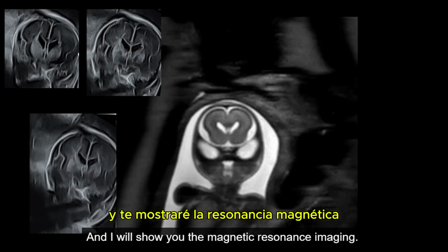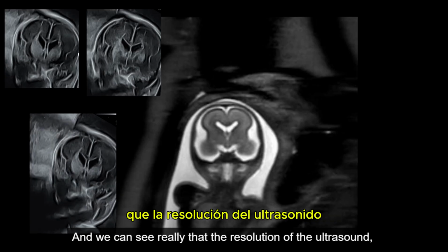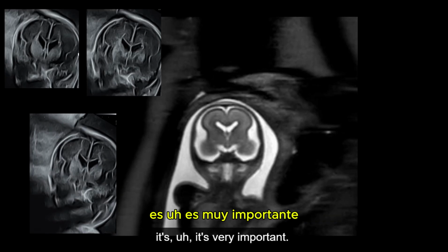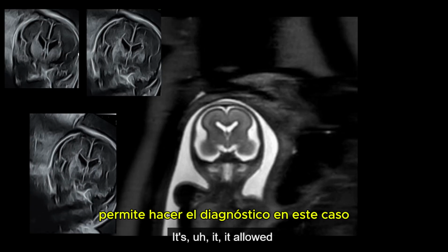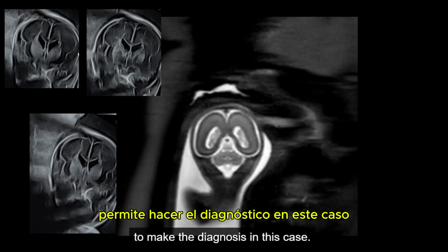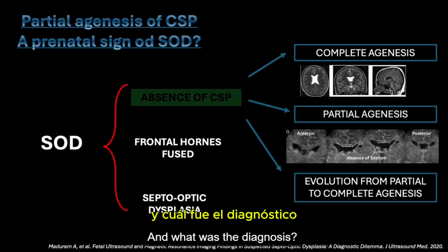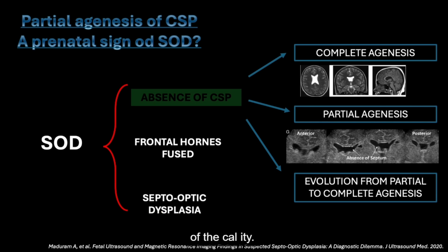And I will show you the magnetic resonance imaging, and we can see really that the resolution of the ultrasound is very important. It allowed us to make the diagnosis in this case. And what was the diagnosis? The diagnosis was partial agenesis of the septum pellucidum.